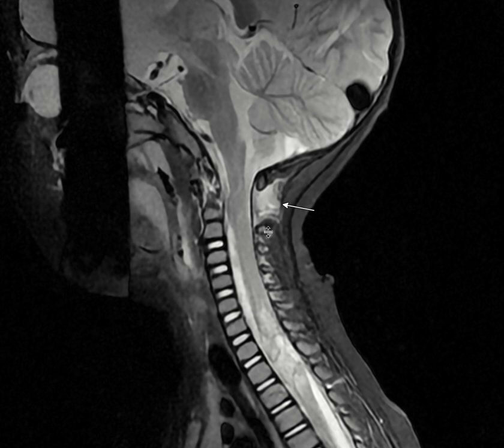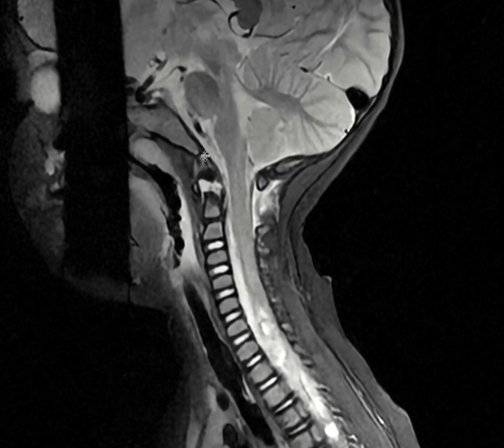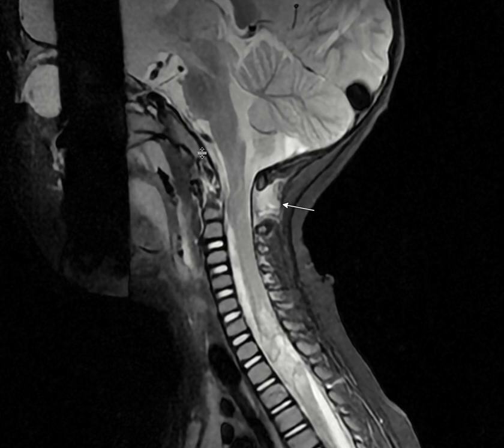Here I'm pointing out the ligamentous injury. This is the area of the nuchal ligament, in its anatomic position, that is injured. You see that this is a ligamentous injury right there. And then, more importantly, you see that this is the tectorial membrane, which is disrupted. So the tectorial membrane is disrupted.